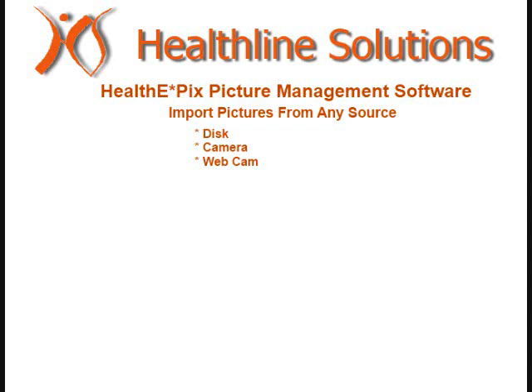For example, a nurse performing wound care treatment might need to use both hands to assist a patient into a position where the wound could be seen, such as a patient with a pressure ulcer on his back. Using a gooseneck-mounted webcam, the nurse could help the patient into position while HealthEPix takes a series of pictures.